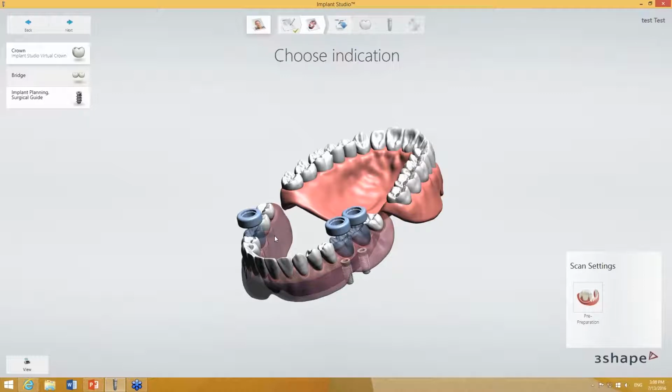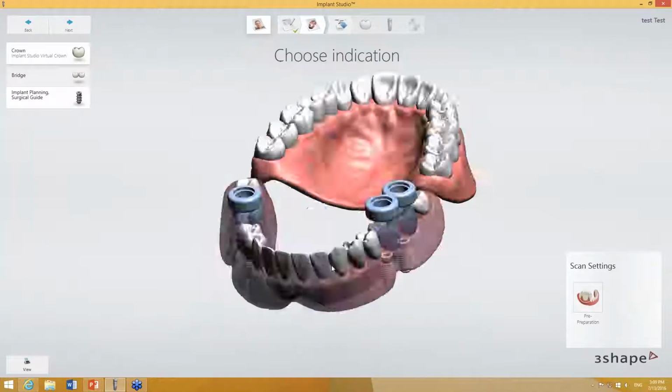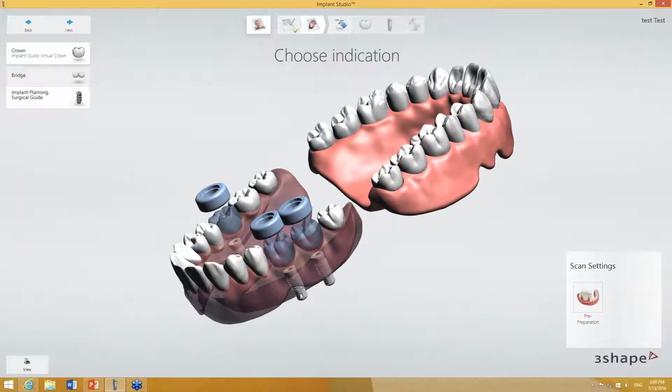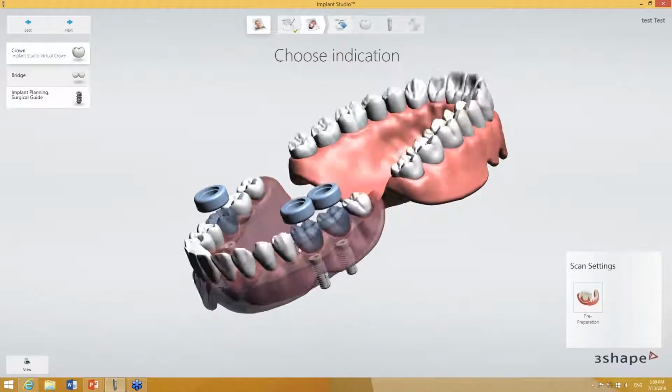If we have access to the anatomy design, software will treat it very easily, and it will help us at the initial placement of the implant. As software can recognize the long axis of the tooth, it will place the implant right under the anatomy that we're going to design right now. Okay, I think that this is absolutely enough setup that we will have. As you can see, the 3D order form gives a clear preview of what we are going to order. So there will be an implant planned, there will be a drill guide, and of course anatomy design in between.